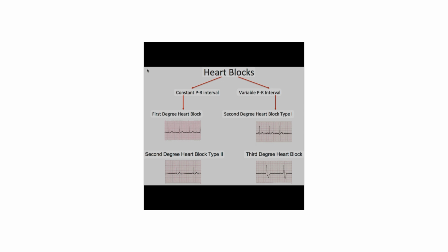Use this breakdown as a quick and effective way to reinforce your understanding of AV block classification.